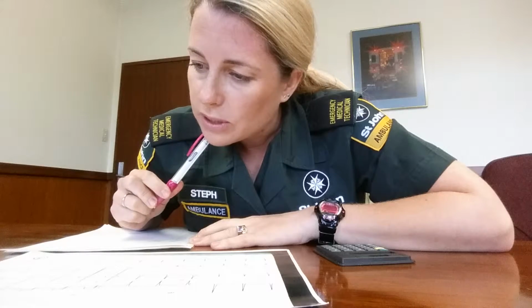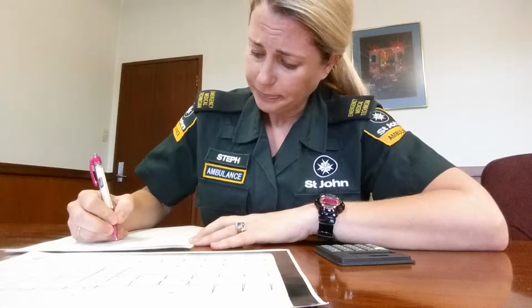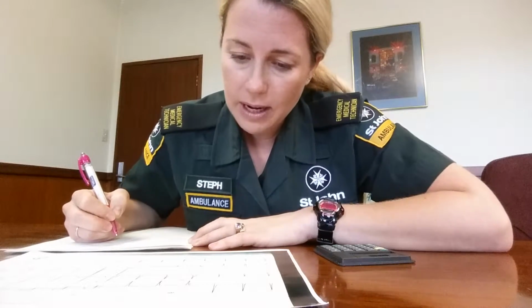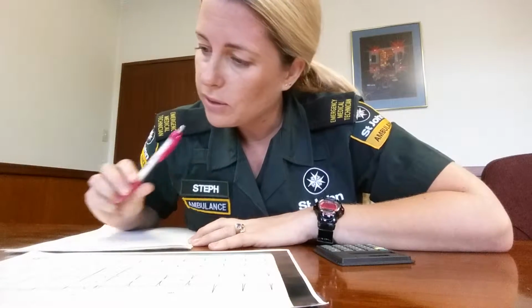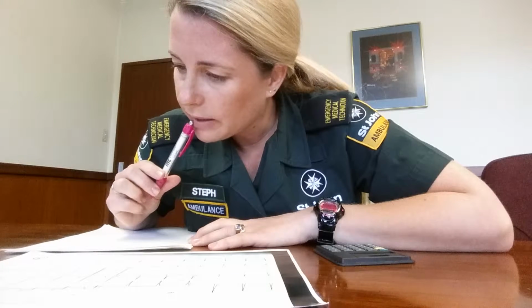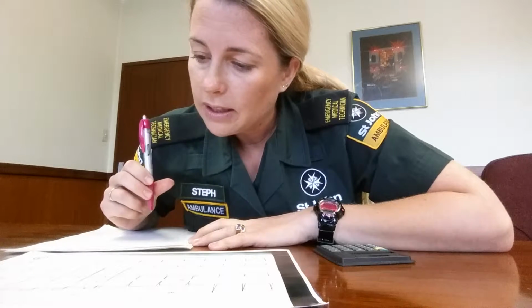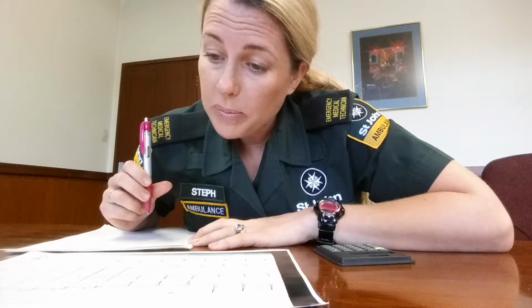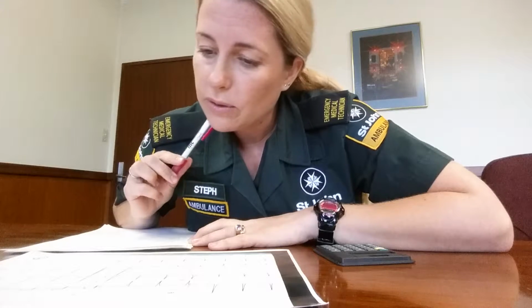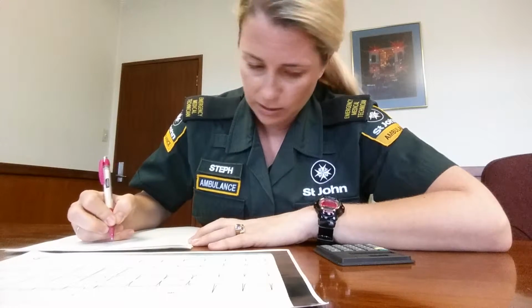But these changes usually go along with Wolff-Parkinson-White as it's a STEMI mimic. And T waves should be asymmetrical and upright. We have some negative in the lateral leads, V4, V5 and V6, and tall, peaky, higher than 2/3 the height of the R wave in V1 and V2. So we have some ST-T wave changes.